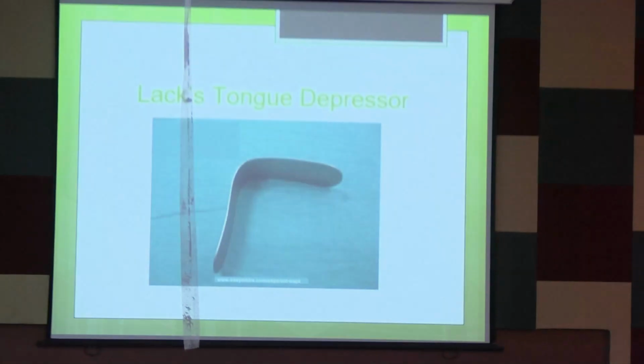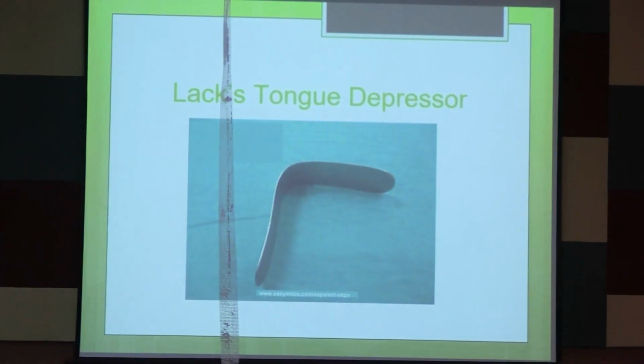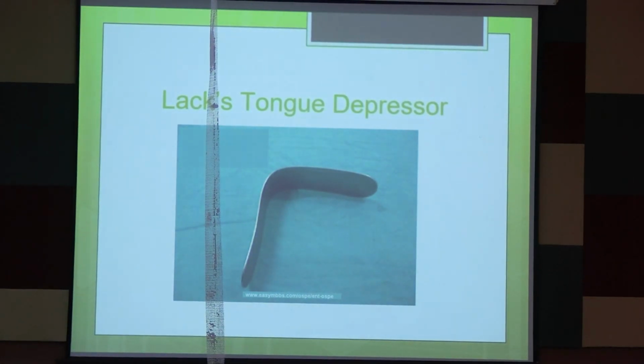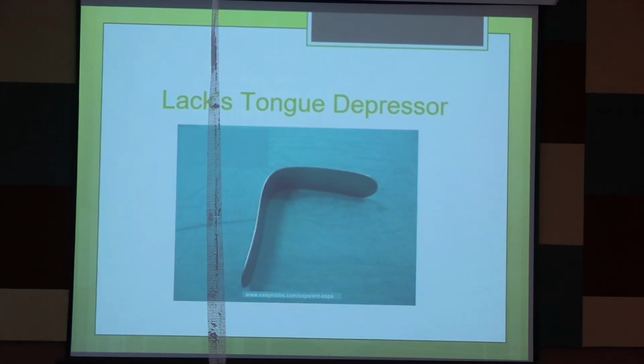This instrument was already taught in the morning. This one is a tongue depressor, Lack's tongue depressor, right? This is to hold it here, okay? You need to hold it here, and this one is to depress the tongue. Right? While depressing, the tongue will be inside your mouth, not outside. If you press it while saying stick your tongue out, there will be trauma, okay?